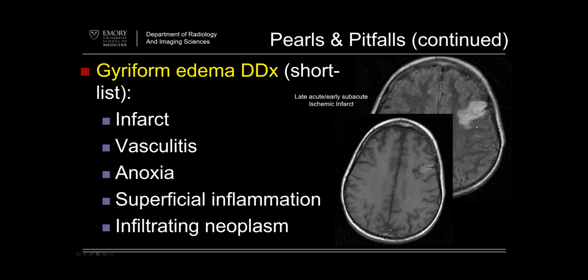Don't forget about subacute infarcts. They can be the initial presentation. The patient may have had an infarction, say in the frontal lobe here. This probably would have been evident clinically and shown up earlier, but imagine it wasn't, maybe on the other side, could have been clinically silent. And then they come in later and they have what looks like a mass, right? With some positive mass effect. And maybe you're worried that it's neoplasia or infection or inflammation. It might partially enhance. It might be in that subacute phase and enhance.